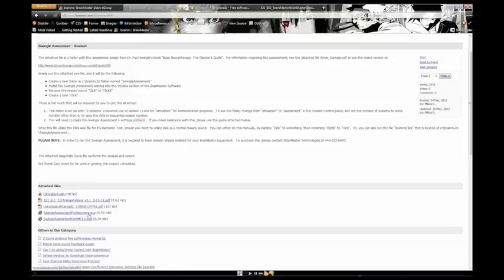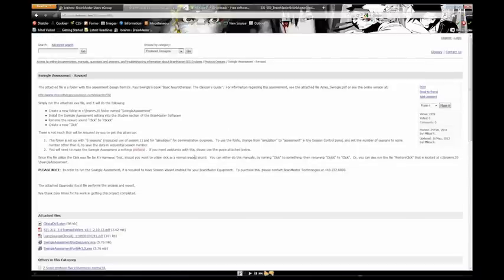Here it is. Here's the one for the Discovery. Here's the one for the 3.0 software. Here's using the Swingle Clinical Q. That's from Gary Ames. That is his XLSM file that he has to do that, as well as the 3.0 trainee folder documentation so that you can learn how to basically bring in files like that. But this right here tells you how to change the click.wav for its harmonic test. All right. Any other questions on the things going forward so far?